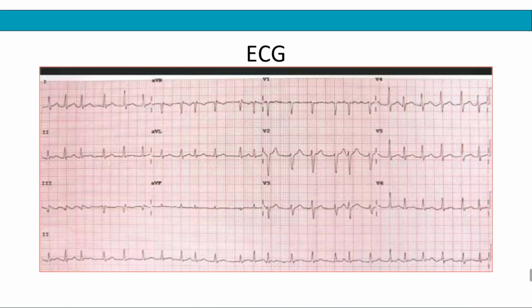But the general approach to reading an ECG is that when you are given the ECG strip, you try to pick up the demographics of the patient, try to confirm the age, sex, date, and the speed at which the strip was recorded. All those are important. But in reading the ECG itself, you always want to go through a systematic approach. One is to determine the rate. The rate of the ECG can be determined from any of the leads that have been provided here. The rhythm is best determined in lead 2. We'll come back to that in detail.